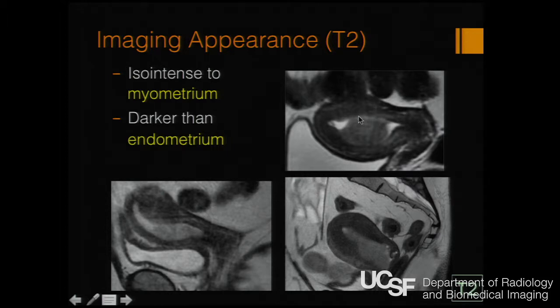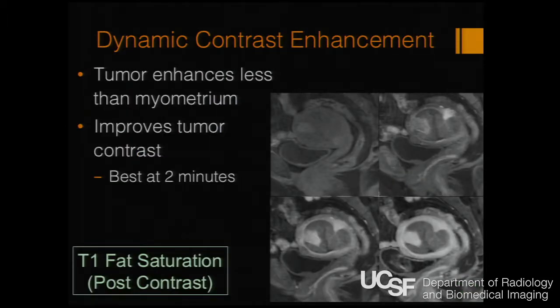Endometrial cancer is an intermediate density mass. It's a little bit brighter than the myometrium, but it's darker than the endometrium. And you can see actually the invasion in the myometrium quite well. But sometimes contrast enhancement is helpful, particularly in postmenopausal women. The junction between the tumor and the myometrium can be indistinct. So looking for a mass, particularly on these delayed images, where you can see the boundary between the mass and the hyperenhancing myometrium very well, helps. So there's the tumor, and this is a myoma, which is also visible on the post-gadolinium images.